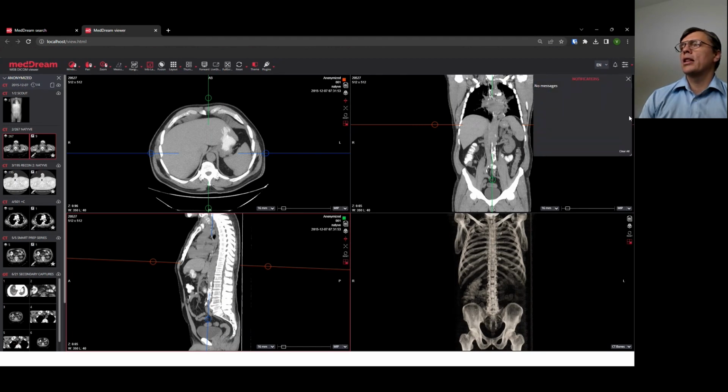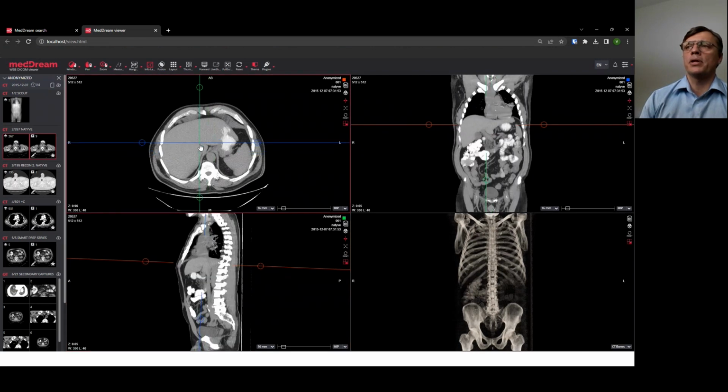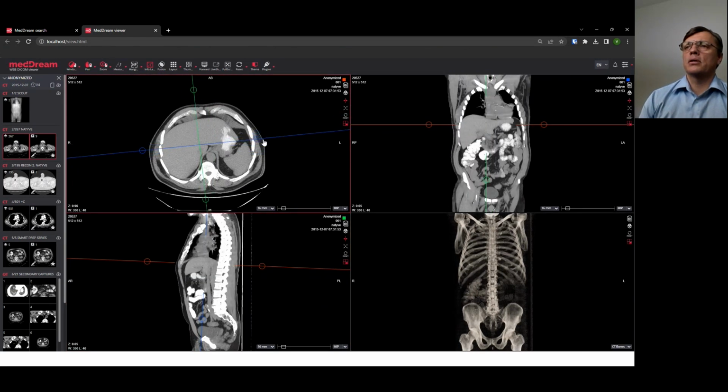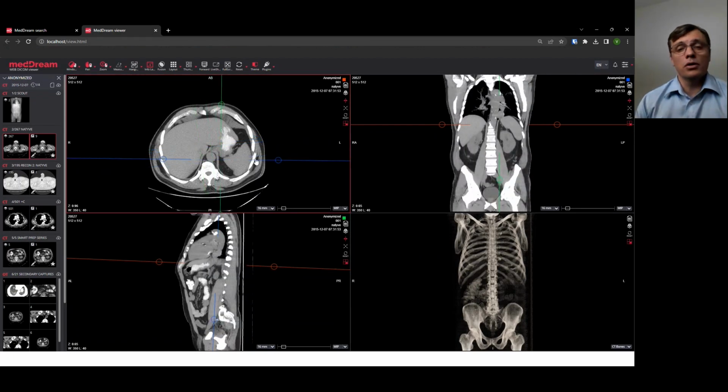During that, you also see the notification. The notification menu allows you to immediately see all warnings and everything that's happening with your viewer during your work session. But it no longer disturbs you. For example, in the past, if some warning said that some personal data or some tags were incorrect, which the user is not able to change, it always appeared on the screen and really distracted doctors. Now they are collected in the notification bar.